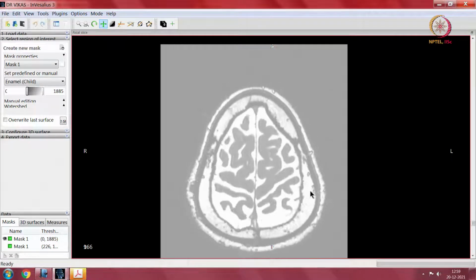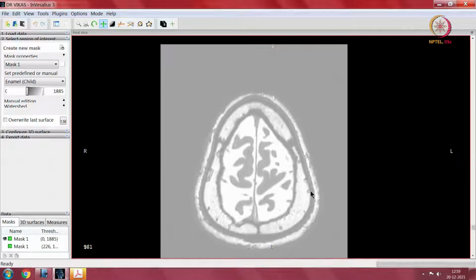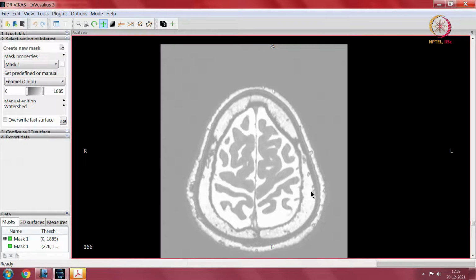Superiorly, towards the topmost part, you can't make out anything, so a reasonable level is here. It sort of varies; with some experience you would understand. So, 2-3 landmarks I have told. One is starting from the center and going way behind. It is a continuous sulcus, unlike these things which are broken all over the place. Then the thickness here and here.